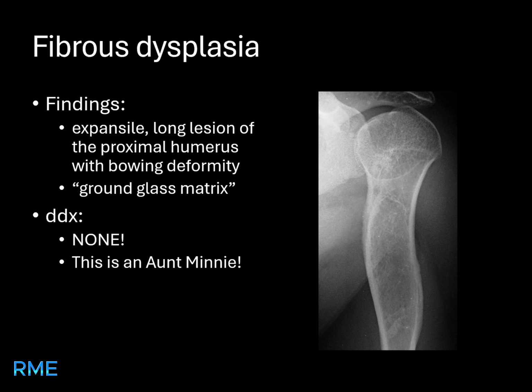No differential diagnosis is needed here. It's an Aunt Minnie. To further evaluate, a biopsy can confirm the diagnosis, but typically the radiologic appearance is diagnostic. Management involves observation and treating any symptoms or complications, such as fractures.